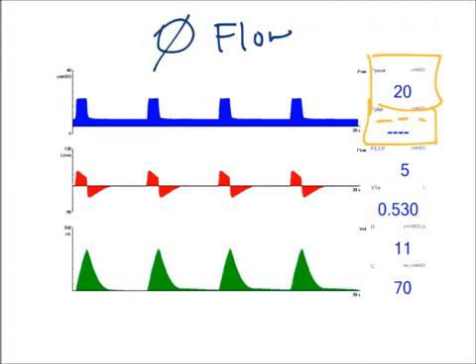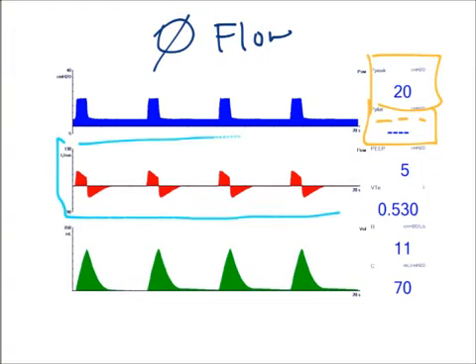One thing we're going to look at is we're going to key into the flow waveform here. And as you notice by my flow waveform, my flow doesn't fully decelerate. And what I mean by fully decelerating, I'm just going to change the color to red. My flow should return to baseline. And this is all based on my inspiratory time setting or my IE ratio setting.